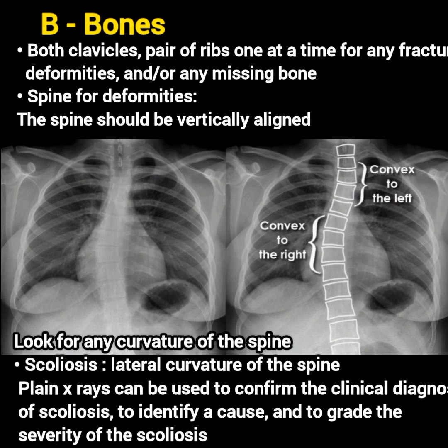When there is lateral curvature of the spine, that's scoliosis. Chest X-rays can be used to confirm the clinical diagnosis of scoliosis, to identify a cause, and to grade the severity of the scoliosis.